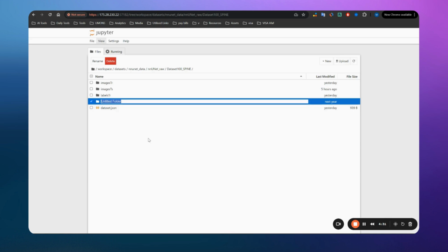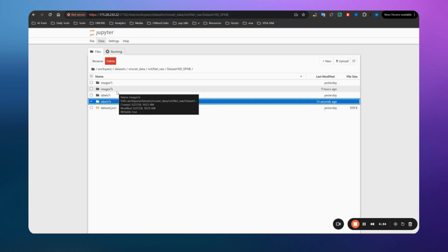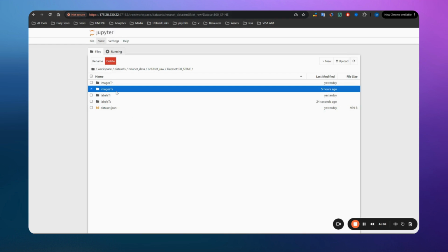Let's call it, for example, labelsTs. This is just a convention. It is not necessary to call it like this. Here I'm talking about the label testing, so we don't care about this, for either the image testing or the label testing, we can call them whatever we want. The most important ones are the training images and the training labels. Okay, and just to mention, the testing images haven't been used until now.